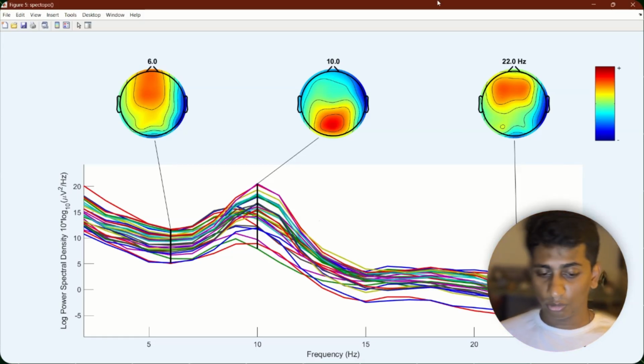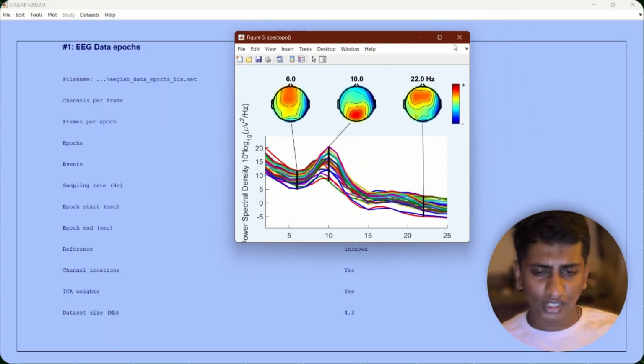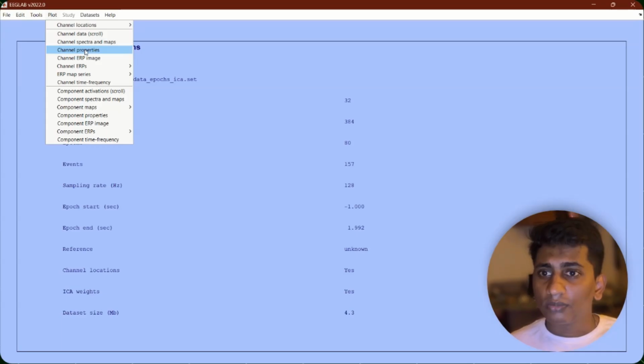But effectively EEGLAB auto designs it for stability. We don't need to give big inputs. This data, whatever I'm saying verbally, is also there in the book. So you can see that, and the power line PSDs and all.